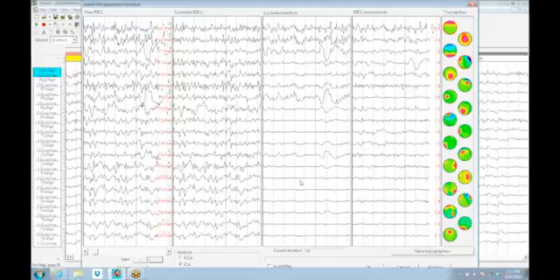The term gain is actually an amplifier characteristic. These are display characteristics, which should be labeled sensitivity, not gain, but that's a very common misnomer. And other than for techno geeks that are, you know, purists, they're not going to really get their nose out of joint about that. But that is a misnomer. It should be sensitivity, not gain. And again, it's changing your display, not the amplifier.